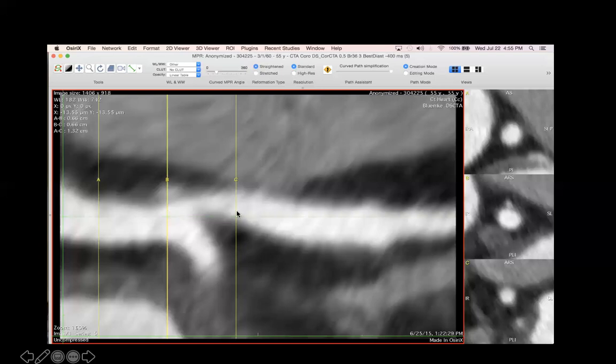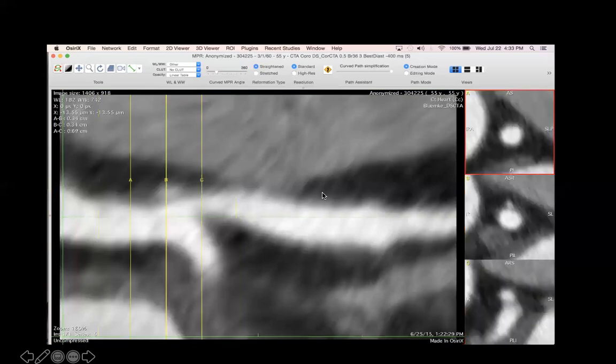When we go down to the distal part where it branches to basically the left anterior descending and the circumflex, we get this cross section. Now, if we go to the next slide, I'll bring in this C. We'll get right to where the LAD branches off, and we can see that that vessel gets pretty small in diameter at that point. It's a lot smaller than it was, even 1 centimeter proximal to that.